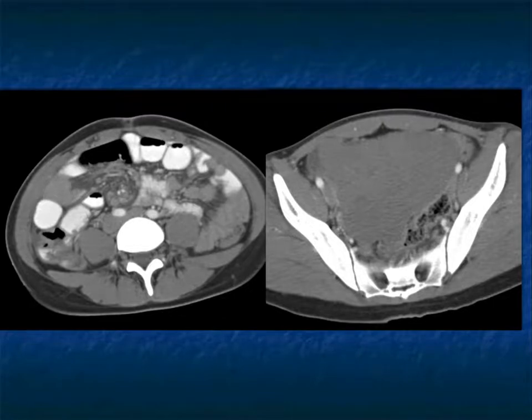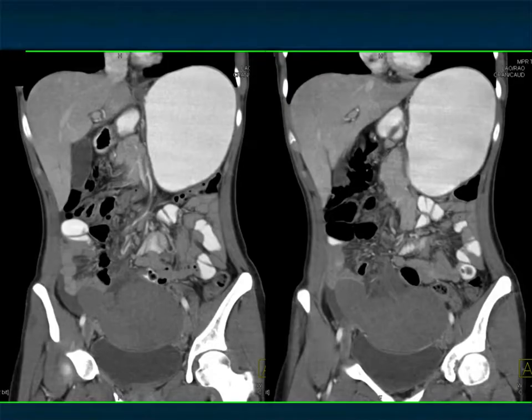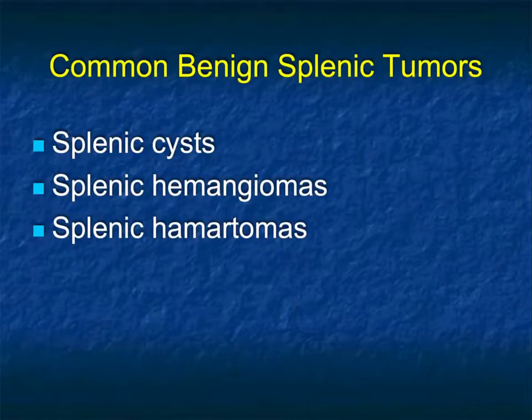Well, as you scan downward, there are some twisty vessels in the mesentery, and there's a mass in the pelvis. That's the spleen. It's not enhancing because it's infarcted. This is a wandering spleen, twisting on its axis with global infarction of the spleen and this pelvic mass. This patient underwent a splenectomy. So again, wandering spleens are unusual entities, but they can be challenging at times and a very, very important diagnosis. And we see that very nicely in this example.